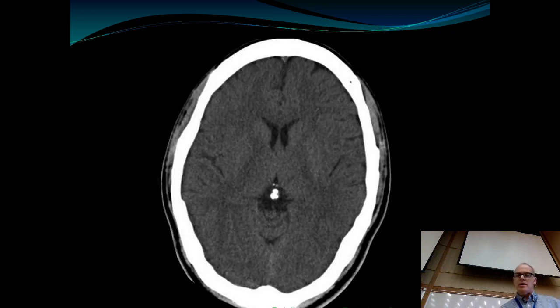All right, so here's a CT scan. And so obviously we have the calcified skull, and you can always tell when you're looking at a CT because, as we'll see, the MRI looks a lot different. So we got a calcified skull, and we have something else that's calcified right here. And so, yeah, this is the pineal gland, which calcifies normally with age.